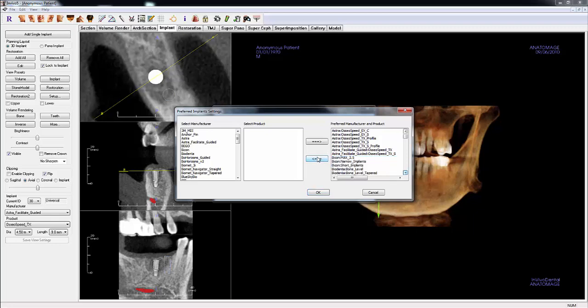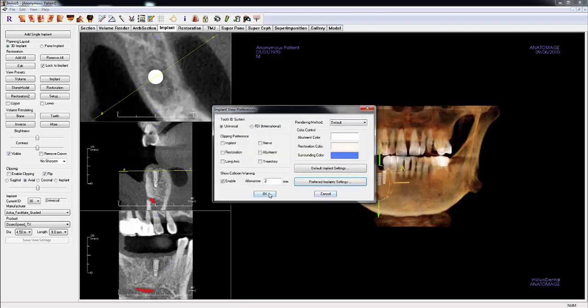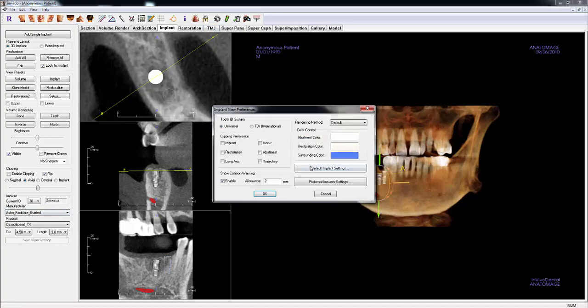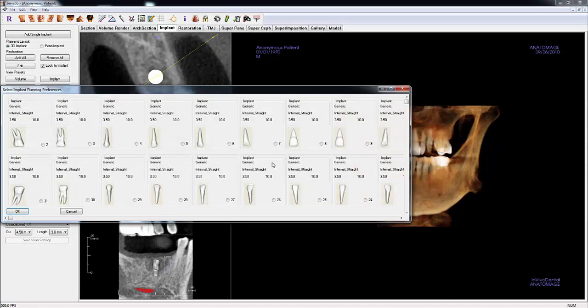During implant planning, if you don't see a certain product or diameter for an implant in the drop-down menu, please switch to the guided version of the implant. If you only use one implant type, click Preferences, Default Implant Setting, to assign default options for each implant number. Now, when you add an implant, the implant will automatically be set in the drop-down menu.